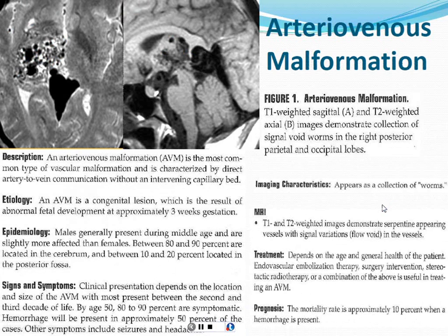Here's an arteriovenous malformation. This is just another one of those developmental things where things don't go exactly right, and you get an abnormal connection between an artery and a vein. Veins aren't used to the kind of flow, velocity, and volume that an artery produces, as well as the pulsation. So the veins will start to enlarge, and you'll get this really characteristic tangled up, or bag of worms, look, as they describe it, of an arteriovenous malformation.